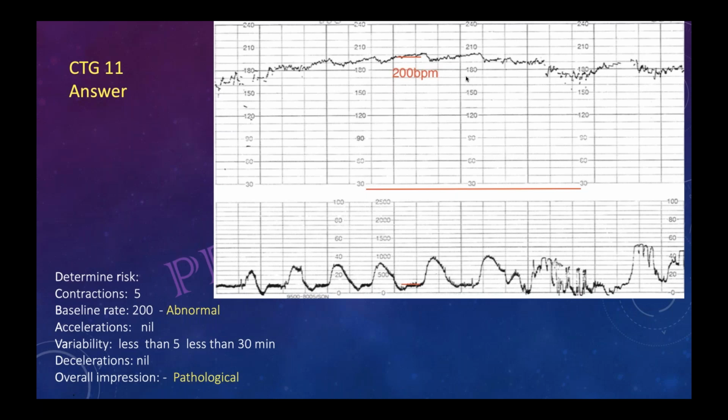Maybe 10 beats, it has gone 10 beats, so it has to be more than 15 beats below. Okay, it is not there, 15 beats are not there. This is one thing. From 190 to 170, the last part towards the end of the trace, it's at 170.